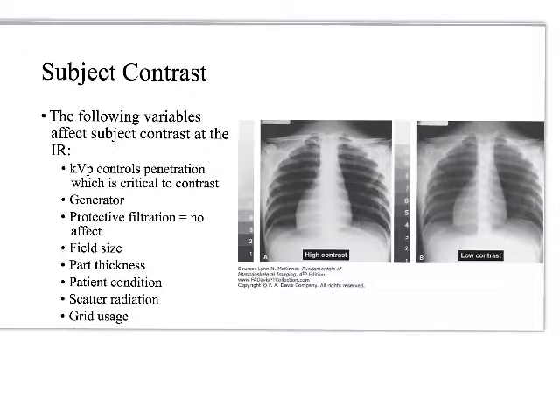So I'm asking for, did I ask the wrong question? Yeah, I think so. High KVP. Which one of these images has a high KVP? The one on the right. The low contrast image has a high KVP, right? And so conversely, the one on the left is a low KVP image because it is a high contrast image. That is a weird way of thinking, right? And it constantly trips me up. I constantly have to remind myself of it.